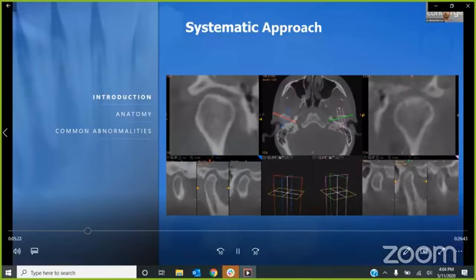Here's a beautiful example of a really nice condyle and a TMJ. As you can see here, there's good volume, and volume being the shape of it, nice and round and bulky. There's a thin and continuous cortical outline. Here you can see in this rest position that the condyle is resting in the mandibular fossa. So it's not where the articular eminence is, it's right nice and center. And there's a nice spacing of where the disc is. Again, we can't see soft tissue, but we can see enough, knowing that there's no osseous changes here. There's no degeneration.